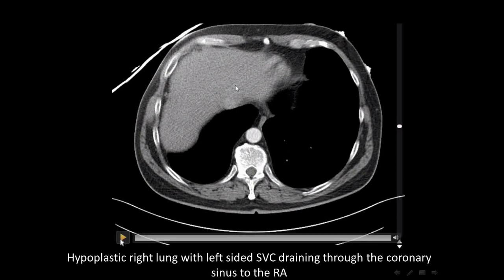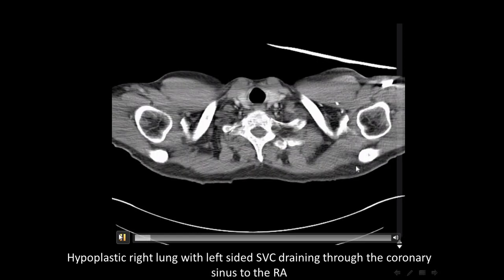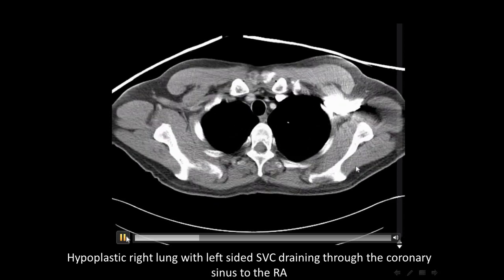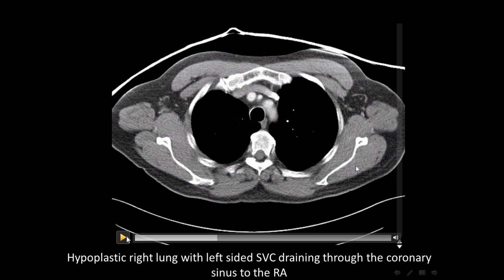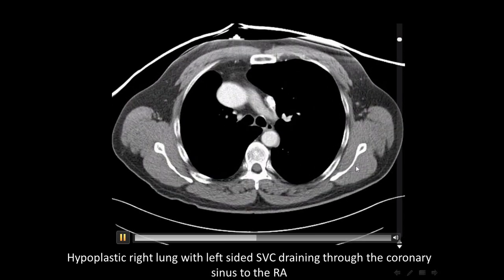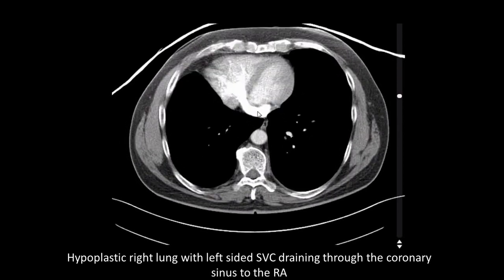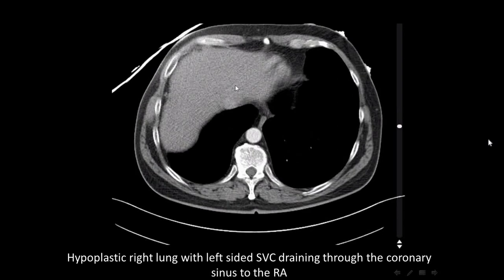So let's have a look here at the contrast agent followed from the axillary vein back to the heart. How was the course of the contrast agent in this case? The contrast agent is almost here. It's coming from the left side. Into the right atrium. To the right atrium, but the location is on the left, right?